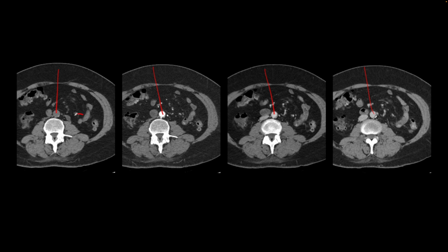In the left side of the abdomen, we find that there is a small bowel loop that shows contrast extravasation, and on the more delayed images, it becomes less intense and larger inside the bowel loop. So this is what a small bowel bleed would look like on a multiphasic CT.